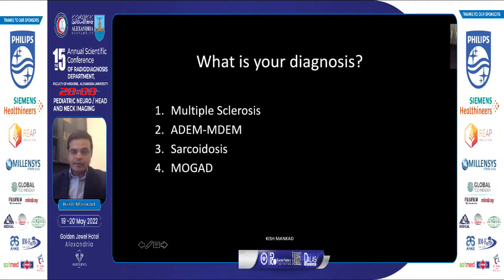The question that begs, and this is for an MCQ Slido for you, is what is your diagnosis? Is this multiple sclerosis? Are we dealing with a spectrum of ADEM and then multiphasic ADEM? Or is this a mimic of multiple sclerosis like sarcoidosis, because the age of presentation was quite atypical? Or is it something else like MOGAD, which is myelin oligodendrocyte glycoprotein associated disorder? Let's go back to having a look at the picture.